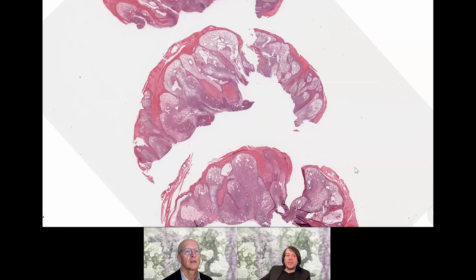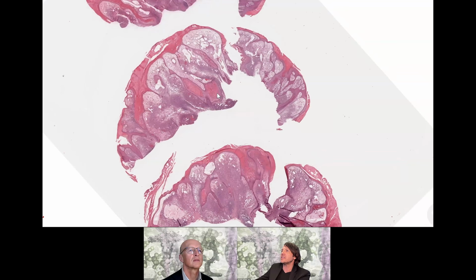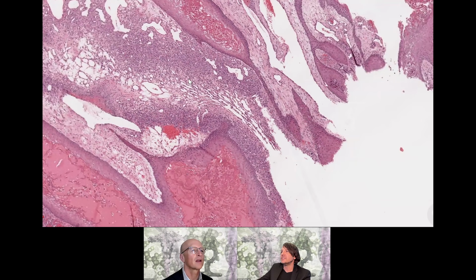All right. Well, we can do the low power, we can piece together what we're seeing. And I think that there are some low power clues here that help us get to the diagnosis. Epidermal pseudoepitheliomatous epidermal hyperplasia, looks like. Yeah, dramatic, right?